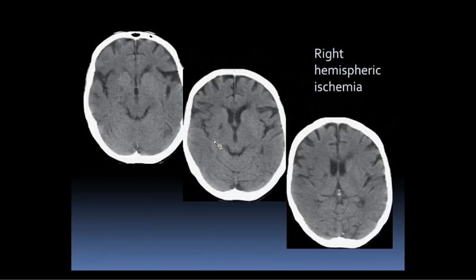step in developing hypodensity, which comes from accumulating edema, is that the gray matter just becomes less dense than it normally is, and it becomes isodense or similar to the white matter. So that's why you have the loss of gray-white matter differentiation. You just have kind of a smudgy gray appearance. So this is kind of a common appearance of acute stroke on CT.